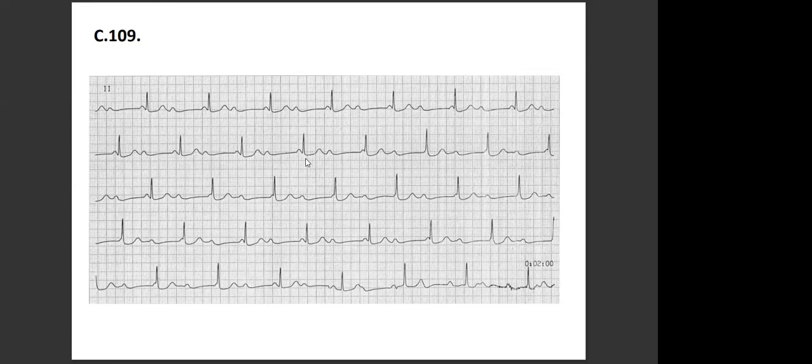This is why it is important to look at the PR interval, whether it's changing or not. Because it's maybe not every beat. If there are teeny tiny changes, you can see the PR takes a much longer time when the P gets inside the QRS complex, or when you see that the P is not exactly proportional to the QRS.